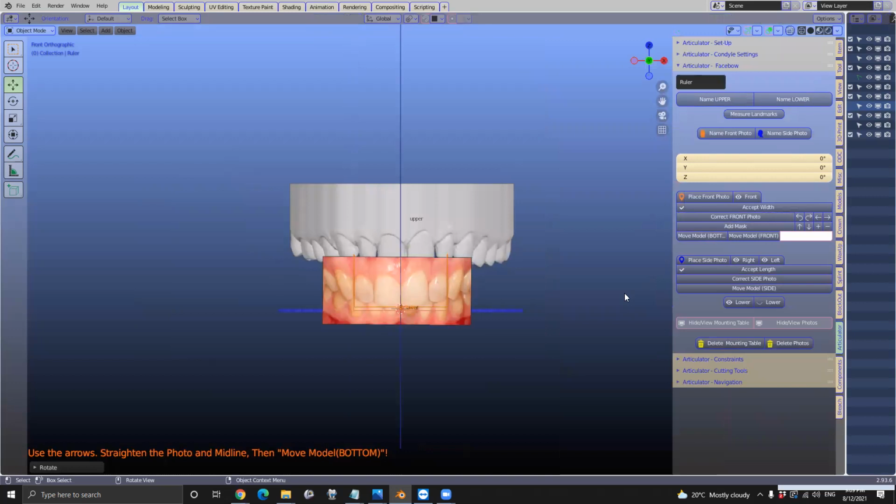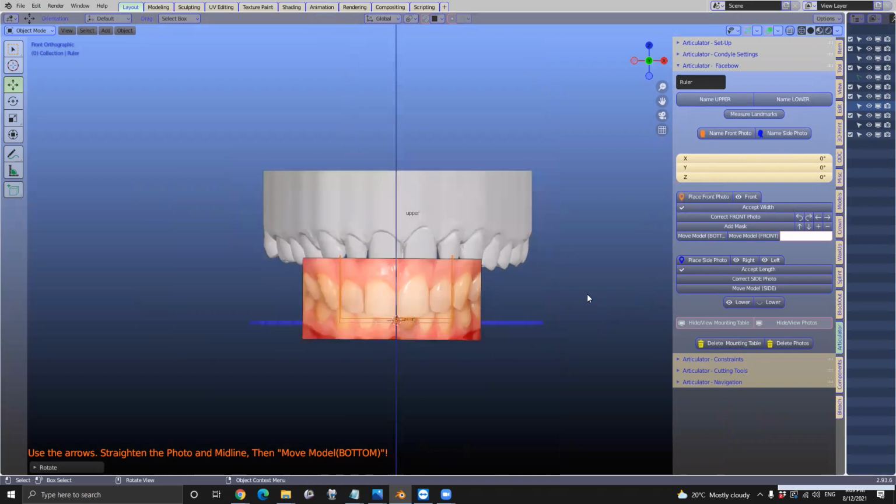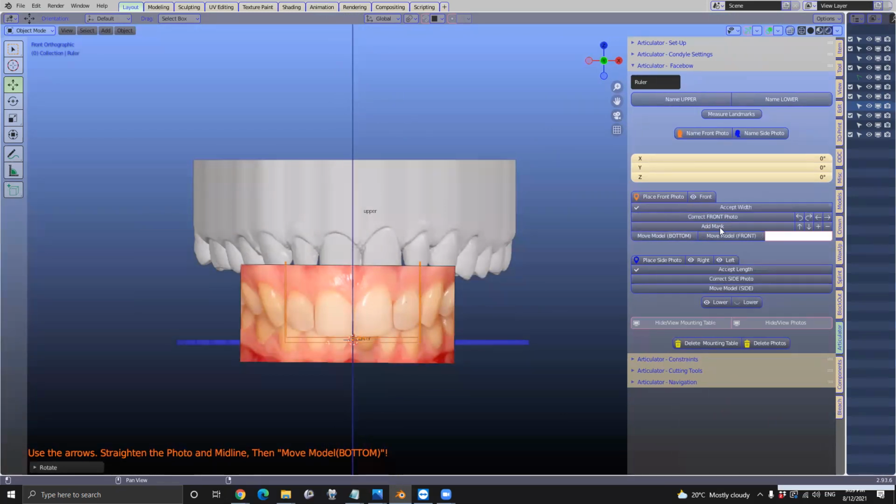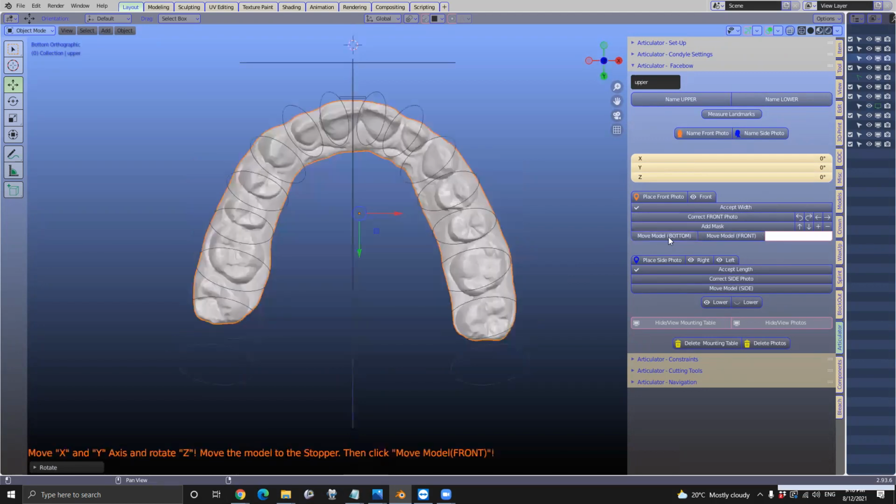Wolf, can you just explain why it's actually quite good to use a mask in the facial? Yeah, so the mask is a golden proportions mask, and it's got in it a template of the pupils, so you would match the pupils. That gives you a nice horizontal line, and the midline, you can target it towards the middle of the nose and running downwards. So it gives you a better idea where the centrals should be in relation to the midline of the pupils. That's good. But because we don't have a full face image, we're going to skip the mask and move to the next one.